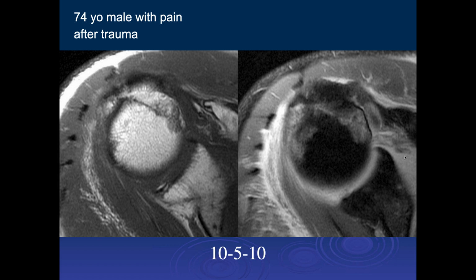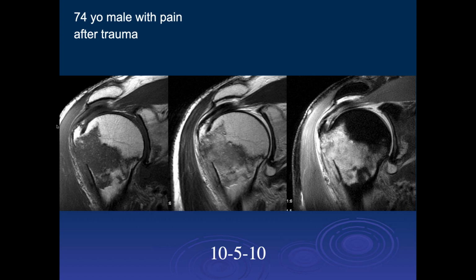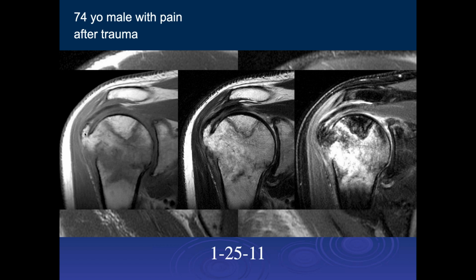So a few months later, this is. Oh, okay. So you've got some partial osseous healing of the previous plane of fracture, and you've got a big osteophyte coming off of that greater tuberosity, and then you have another part. Oh, it was there. Okay. And then you have another fracture actually on the superior humeral head, almost like a V-shape fracture extending there.